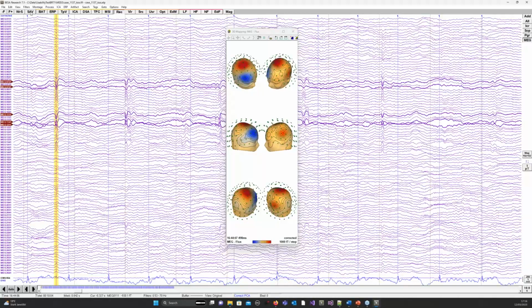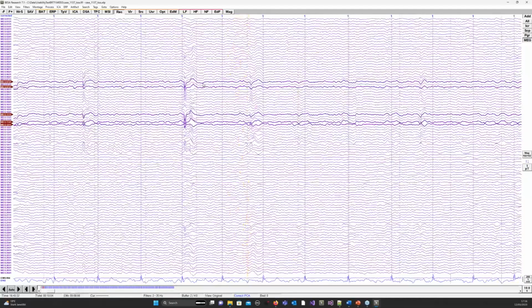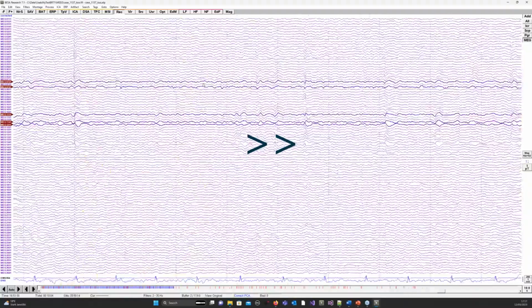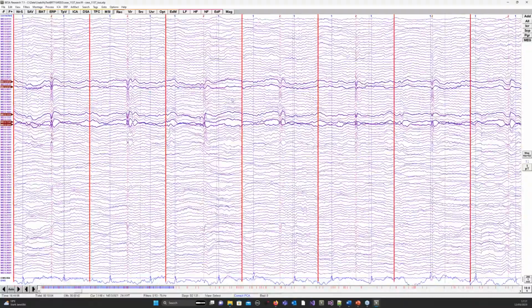Again, using my SAV. So now I'm going to put them into the tag number 2, the selected channels. I've got an optimized filter and buffer width, and I can just run through the data and find these events. Okay, that's my result. So I can now review the data.